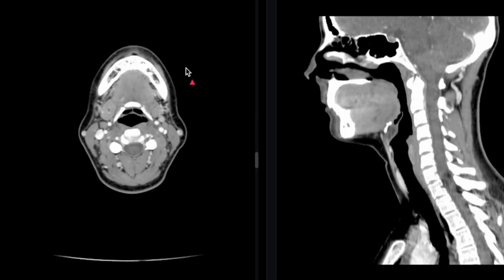The first bone that I'd like to call your attention to, the first structure, is this horseshoe-shaped bone, deep to the chin, ever so slightly, maybe inferior to the chin, but anterior to the patient's airway, this black, very dark circle on CT. So this is the hyoid bone. And it's also really easy to see on the sagittal view. It's just this really dense bone kind of floating in space.